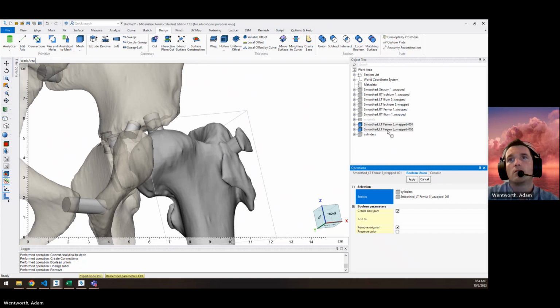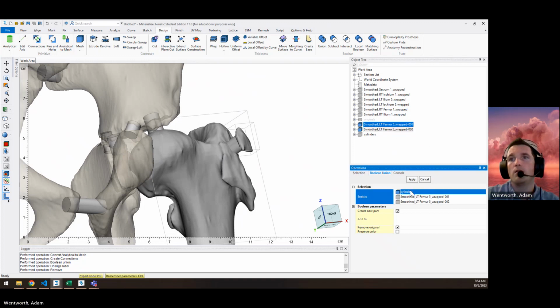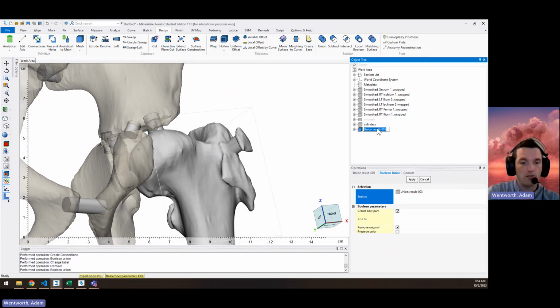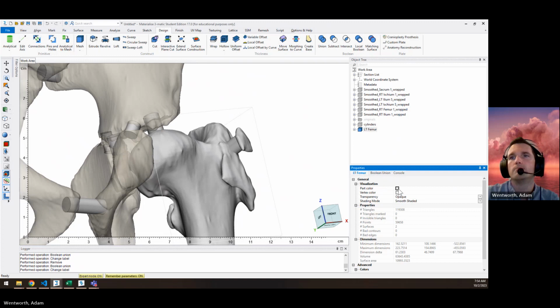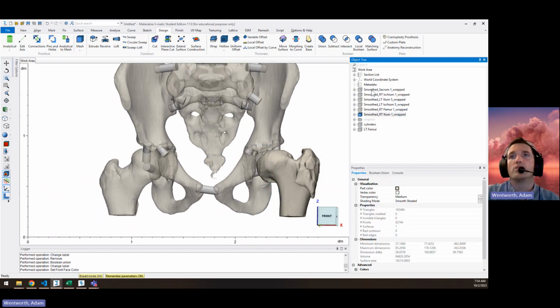If we want to make that easier, we can also duplicate any parts that have multiple pieces before we separate them. That way, once these cylinders are made, we can just delete those extra parts, and we don't have to worry about having them be the same color or needing to rename them like this. So first do a duplicate and separate shells to parts. All right, so now all the parts are 3D printable, not floating.